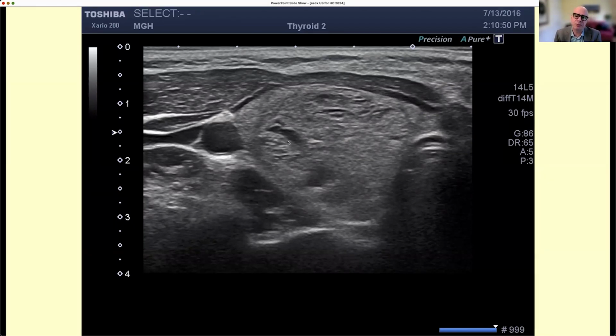Unfortunately, it's important to realize that even in nodules that are solid, there might be cystic-appearing components that are not actually cysts. They might be necrosis or big blood vessels. So you have to be careful when you consider these spaces as necessarily cystic by pathology. And so I really do consider nodules like this equivalent to a fully solid nodule.